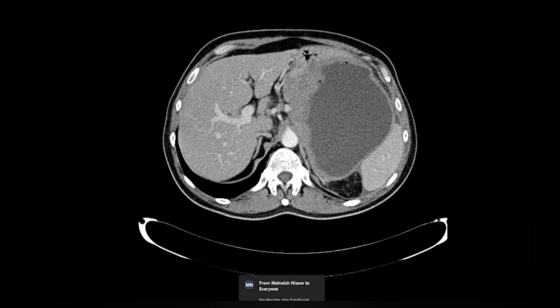Do I have any other images or should I stick to that? No, this one. Okay. So seeing such a dilated stomach, I'm thinking of any pyloric obstruction. Why do you say this is a distended stomach? Because the walls, because it is due to the location of the.